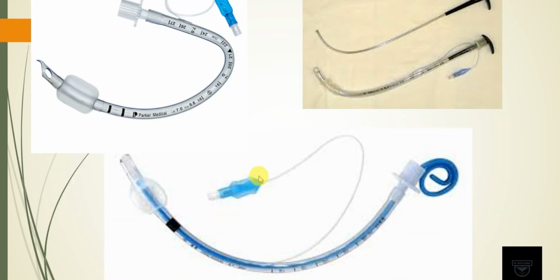So this is what the ET tube looks like. There are different types of ET tubes. These are for adult patients. This ET tube, the diameter is usually seen here. So where you see ID, it's 7.0. This is a size 7 ET tube, but this is a south-facing ET tube.